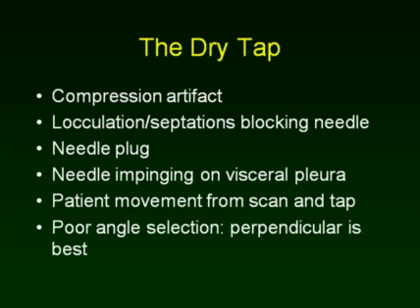With ultrasonography, there'll be dry taps. You see the effusion, but the needle doesn't return fluid. Number one would be compression artifact, that the measurement for distance is underestimated because the edema has resulted in compression artifact.